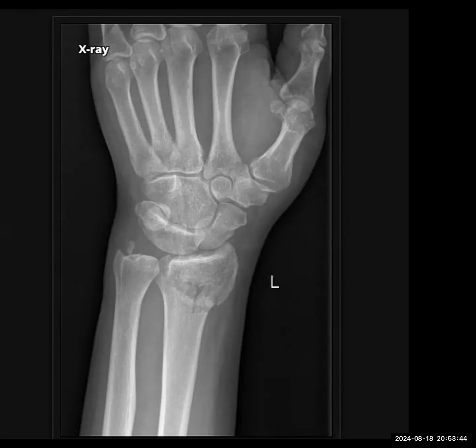Okay. This is an oblique view of the same patient. You can see that there is a comminuted fracture extending to the articular surfaces, and there is displacement of the fracture fragments. I'm also suspecting there is a distal radioulnar joint disruption. There is ulnar deviation. Other than that, I'm trying to look at the scaphoids. Scaphoid was fine, as you told. Okay, so yes, that's all I can think of in this patient. Sure, we can go to the next case.